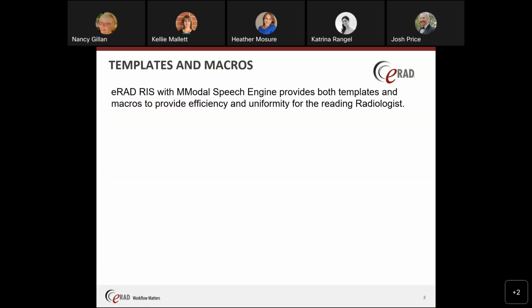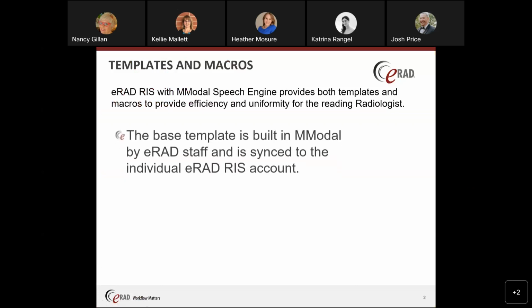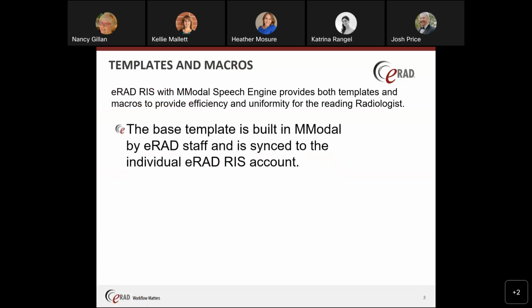So we're going to talk about templates and macros. eRAD RIS with the MModal speech engine provides both templates and macros to provide efficiency and uniformity for the reading radiologist. The base template is built in MModal by the eRAD staff and is synced to the individual eRAD RIS accounts for our customers.